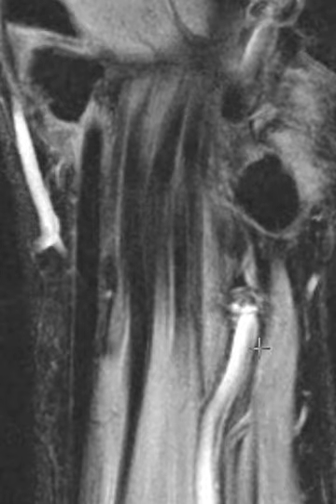And you can see the ulnar nerve. So the ulnar nerve comes across right here, it's a bright band, and right here you can see it displaced and compressed a little bit by that loop of the artery. So I believe this may serve as the etiology for the ulnar neuropathy right here. And also as it goes into Guyon's canal right here, you could argue that the ulnar artery is a little bit tortuous and it's pushing on the ulnar nerve as it goes into Guyon's canal. That's a softer call.